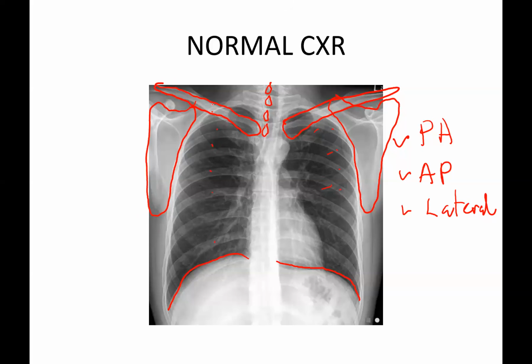So these are the important features of the posterior anterior view: scapula away from the lung field, slanting clavicles, teardrop appearance of the cervical spinous processes, more prominent posterior ribs, and at least 7 ribs above the diaphragm.